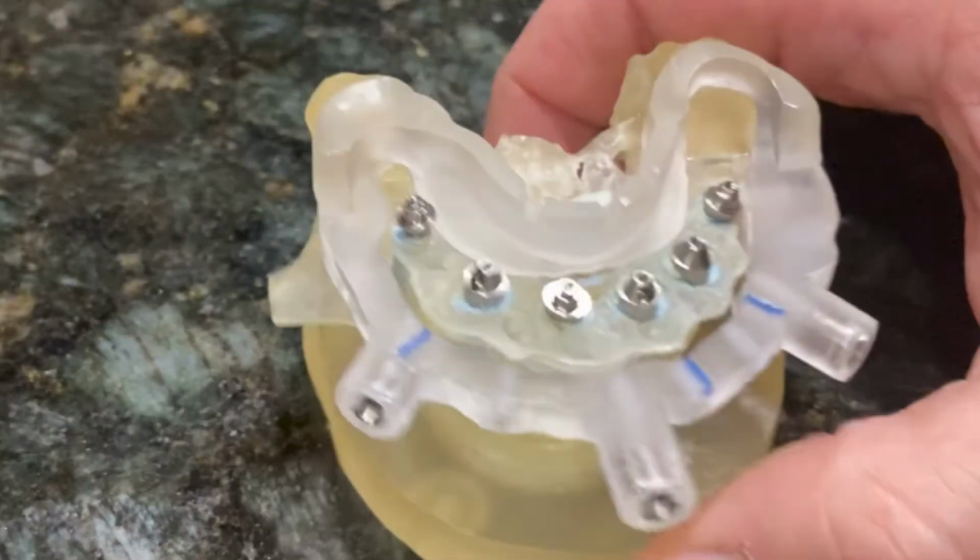This picture shows the abutments on the model, and as I said before, that's identical to what is seen in the patient at the time of implant placement. And like everything else, those abutments have been predetermined, the angle, the size, the dimension, to line up with the eventual teeth to get the most perfect result.